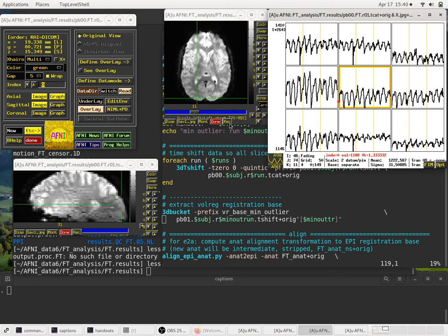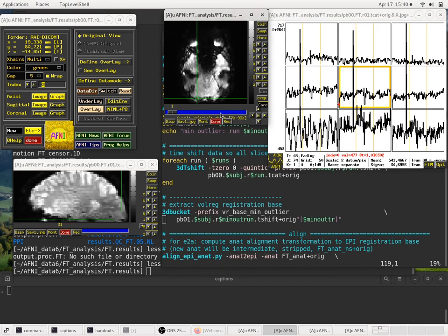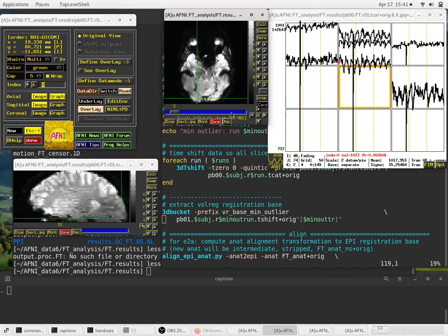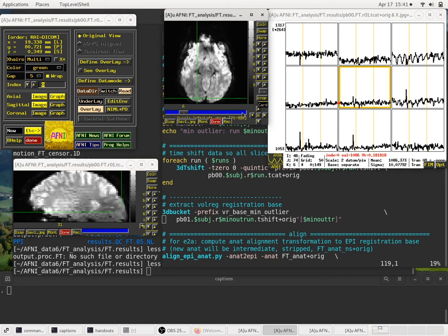So each slice, if we go down, for example, to slice 0, you see slice 0 is acquired at time 0. Slice 1 is at time 1.030, so that's half a TR later. So after acquiring slice 0, we didn't acquire slice 1, we acquired slice 2. That's at time 0.0606. Slice 4 is at time 0.1212, etc. Then at slice 32, we're like half a TR into it.